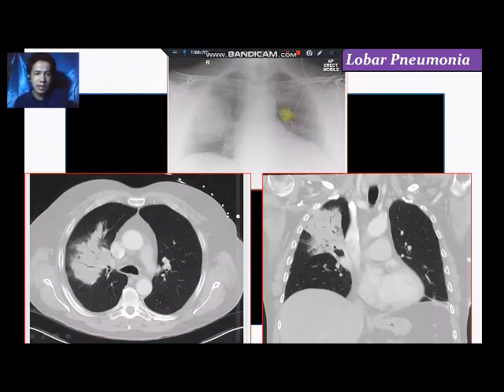Okay, so this is a CT scan image of a patient having lobar pneumonia. Pneumonia can be demonstrated using conventional, general radiography. But then for the extent of the pneumonia itself, kung asa na gid siya padulong, asa na gid ang mga fluid, then we can do a CT scan imaging for the patient. Okay, so para demonstrate gid nato kung unsa na gid kadako ang iyang extent.